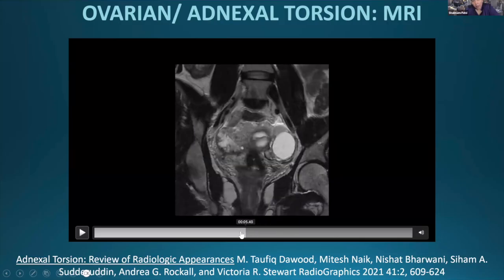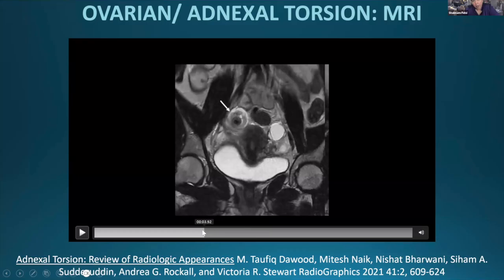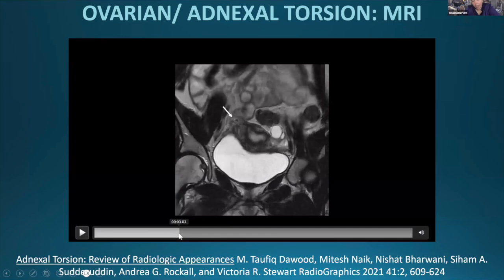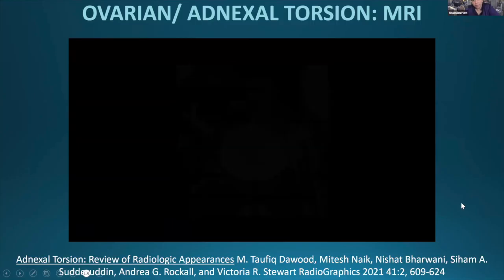And then when I scroll backwards, the arrow is pointing to the twisting of the vascular pedicle, or the whirlpool sign. So hopefully you can appreciate that this is the resource information that you can visit if you want to see that again.